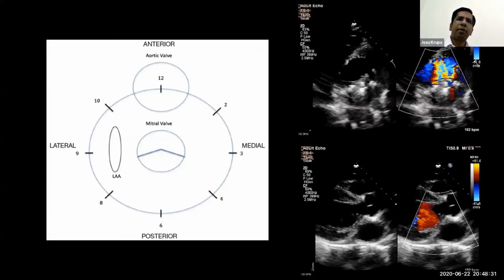So this is how it appears. This is called a surgeon's view. This is the mitral valve, and this is looking at the mitral valve from the left atrial aspect. Generally we get this particular view from the transesophageal echo. When we do a 3D, we will get this particular view. I'll just give some illustrations. On this side, you have the left atrial appendage. This side, you have the interventricular septum, that is medial, and the tricuspid valve would come somewhere there.